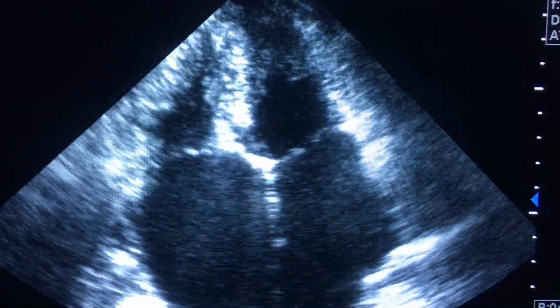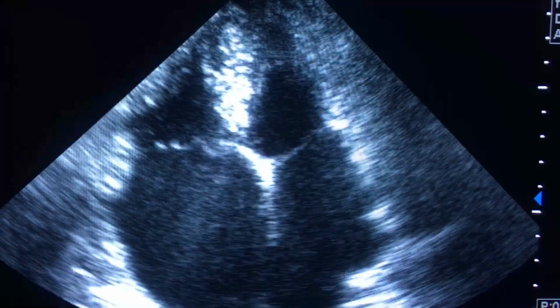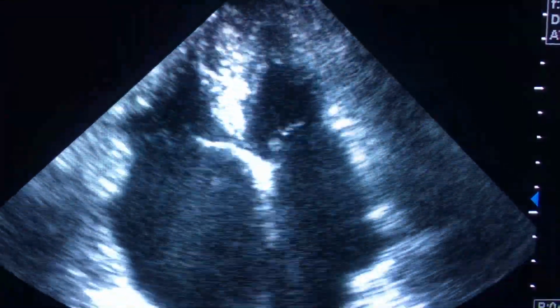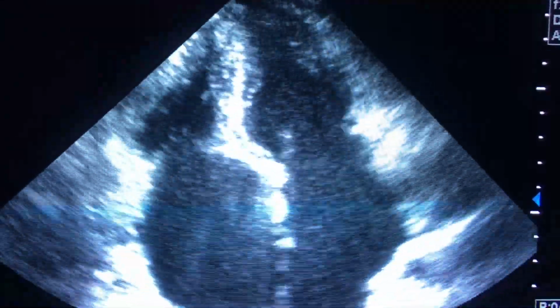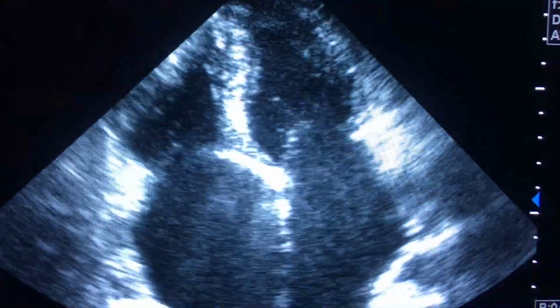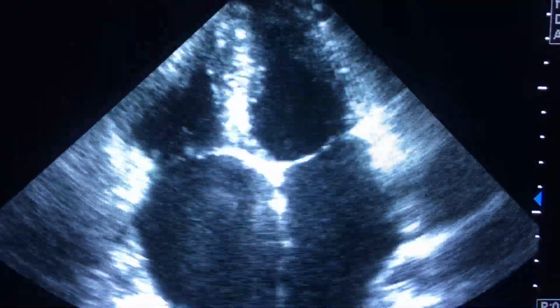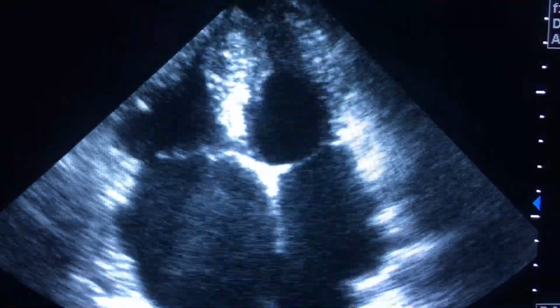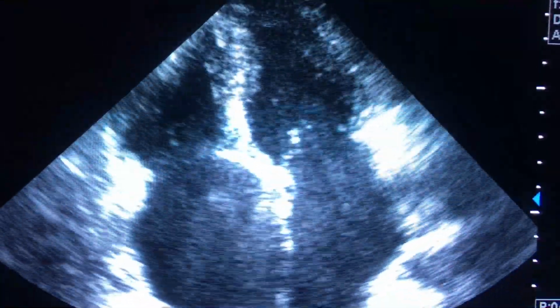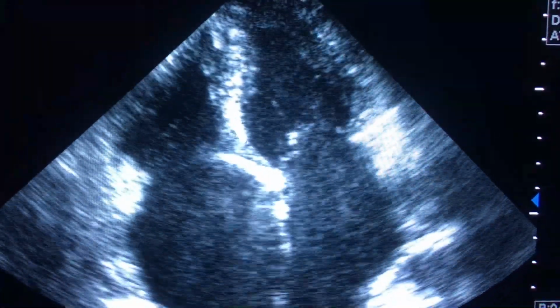As a matter of fact, there is a spontaneous echo contrast in the heart without contrast media injection. A spontaneous echo contrast in the left or right heart is a swirling haziness and is due to blood stasis. It is named smoke-like spontaneous echo contrast, which is mostly seen in a dilated left atrium and mitral stenosis. It is secondary to blood stasis and is related to thromboembolic events.